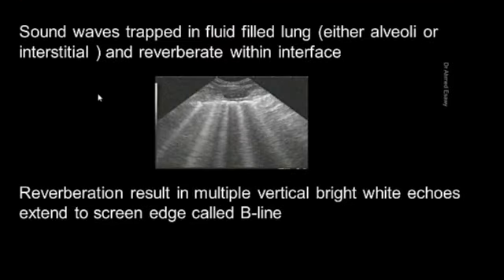Sound waves are trapped in fluid-filled lung, either in alveoli, as in pneumonia, or in the interstitium, as in interstitial syndrome. The trapped sound wave reverberates within this interface.